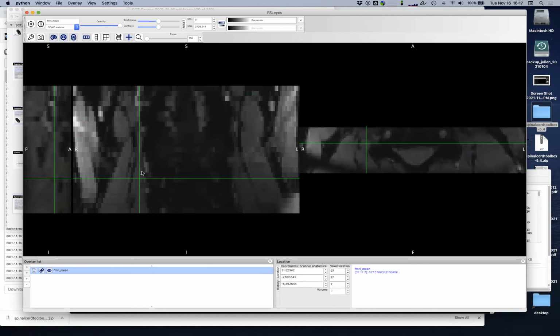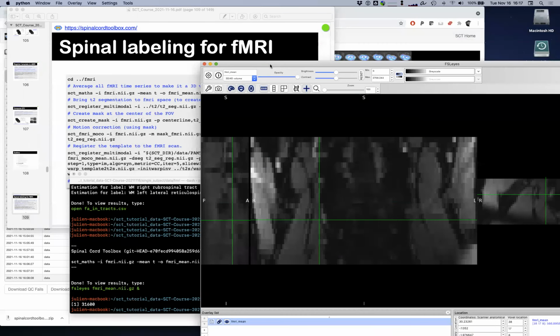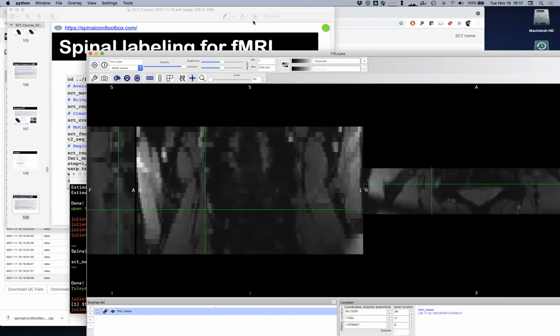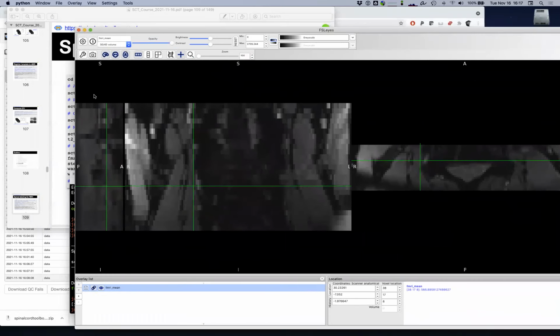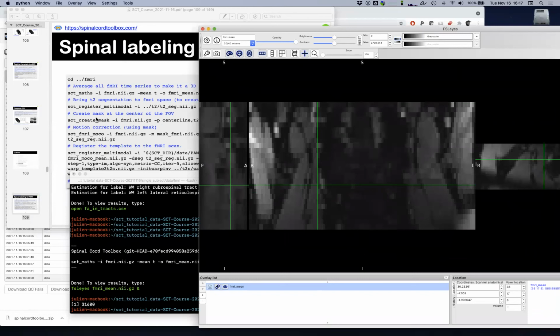It could still work though. So I could bypass what I wrote here and do a first segmentation pass and then use that to create a mask. It's something that we could do. Again, there are different ways to get to Rome, but I basically went with those lines just to show you what the alternative approaches are.